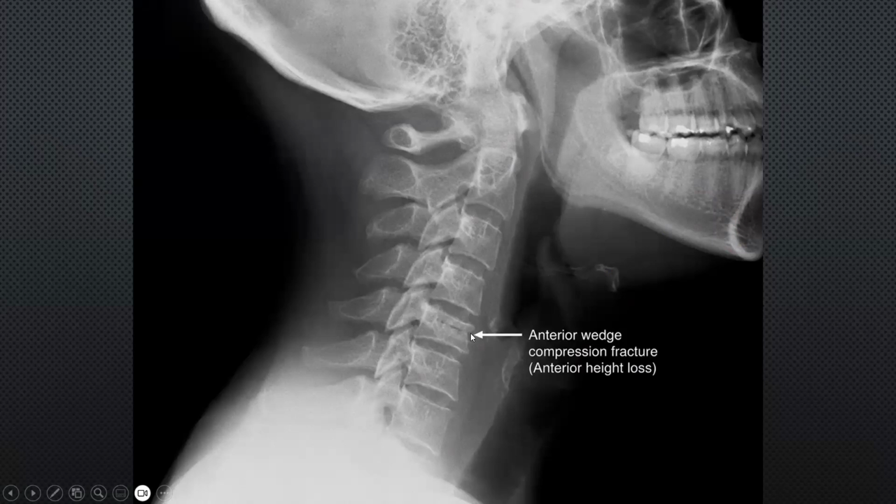If the patient has a fracture, it doesn't mean he has a problem in alignment, right? The patient has a problem in A or B or C or D. B, bone and cartilage, right? So the 1, 2, 3, 4, 5. The fifth vertebral body has a different shape and height of the anterior part. And you have here the cortex disrupted also. Can you see the radiolucent line here? Clear? And the cortex is disrupted here, the anterior line.